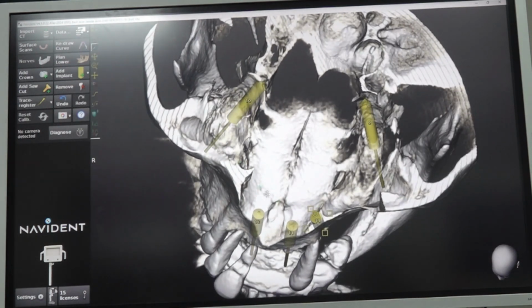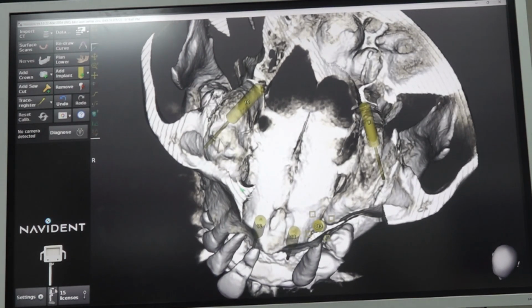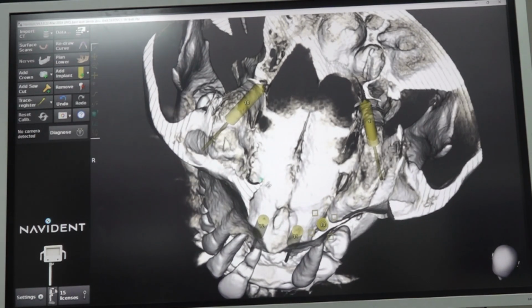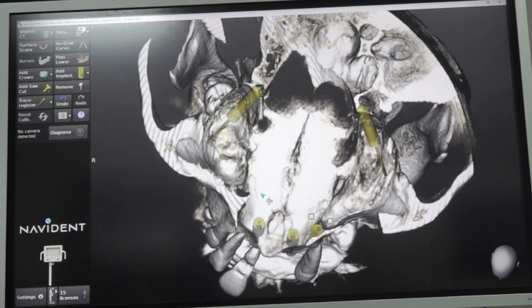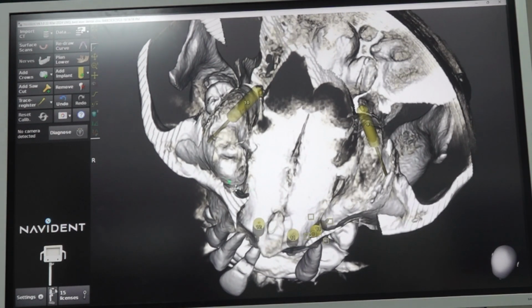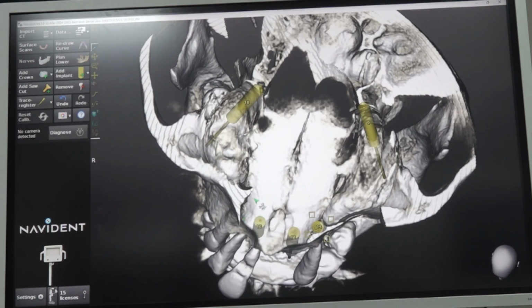So here the buttress is here. Now you will see the implant. The buttress is labially, it is like this. Anteriorly it is bordered by the nasal cavity. Behind it is bordered by the sinus extension. Okay. So it's a pyramid shape. Right?